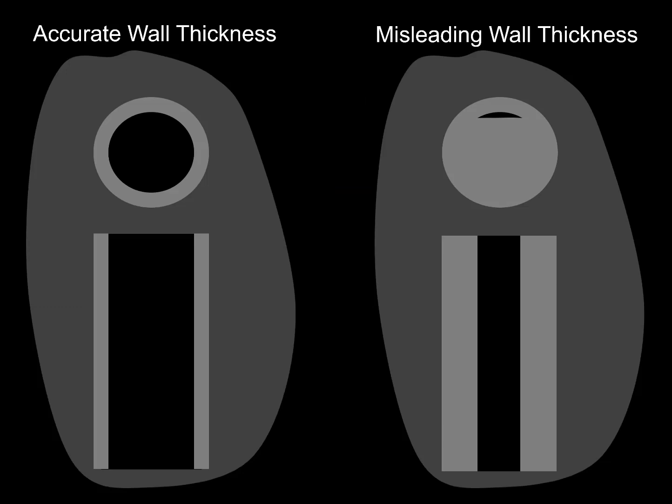And we've gone through this before on the principles slides in earlier lectures, but here, if you have fluid in the lumen, it's going to silhouette with the wall. And it's going to give you the impression as you look at it that the wall may be thick, but we don't really know how much is wall and how much is fluid. But again, we see there's a nice smooth margin here because that's what a gas bubble in fluid should do. If this had an irregular margin, then I would be more likely to think that that's not a gas bubble in the midst of fluid, because again, it should have a smooth margin. So if I see that irregularity, there's a greater likelihood that all of that soft tissue opacity is truly wall.